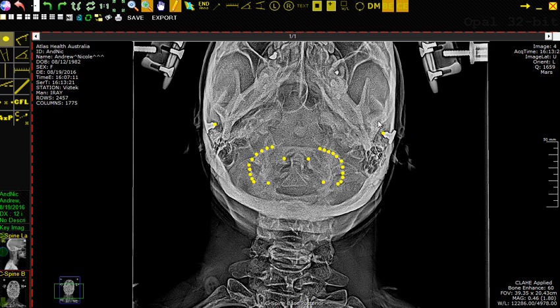So truth be told, this is all that we need to be able to find when it comes to looking at the x-rays. The remainder is about making the line constructions and the measurements so we can actually determine what an individual's unique bone structure is. So I'll do this in a particular order. What we do first is we need to draw a line between anterior point 1 and posterior point 1 on the left and on the right. And if these 2 points have already been identified, that's fantastic. It can just be calculated from that.